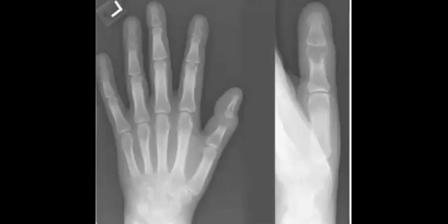No soft tissue association. Maybe just some periosteal reaction here and cortical breaching. So if it is metastatic and aggressive, which cancer can show this behavior? Lung cancer, you will put it as the most common one.